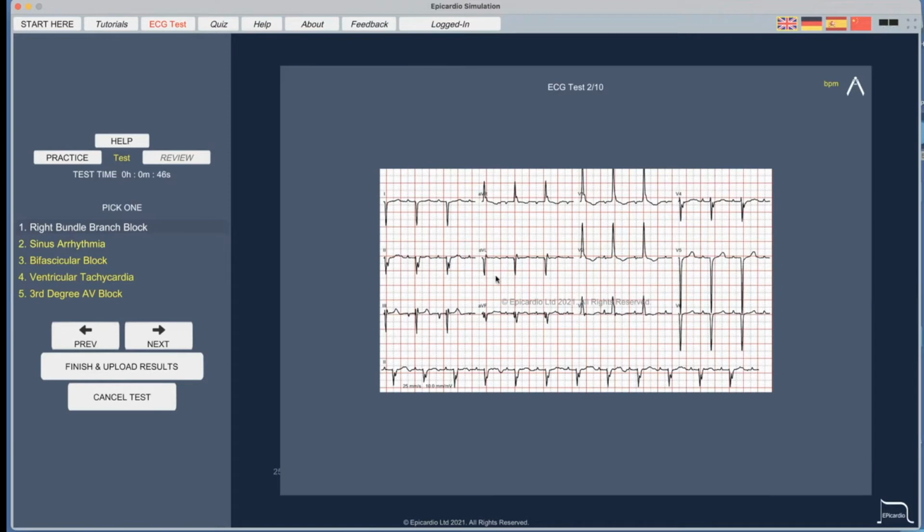These ECGs are actually simulated ECGs. If you would like, Alison, we could actually. Sorry, Lisa. If you would like, you can change this. If you would like to provide us with patient cases in this ECG test, we can make sure that your students see a set of pacing cases instead of simulated ECGs.